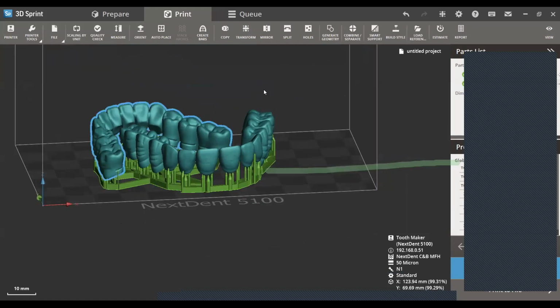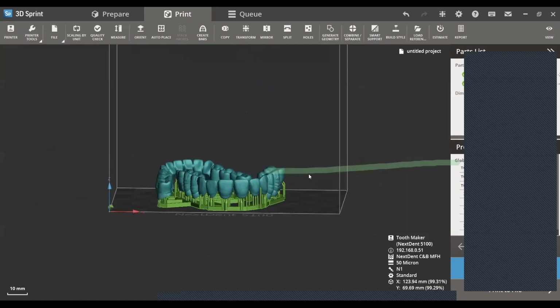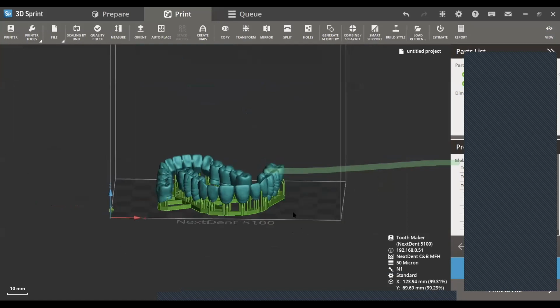Now, when you start stacking, we have special types of supports to allow you to go 8 inches up. So at this point, I would always keep it at 3 millimeters at the shortest part. And then if you're going to angle it, no problem. But I don't put a lot of thought into my height. I just pull it down to the max. Does that answer your question? Looks like it does. Samira, get back to us if that doesn't clarify enough.